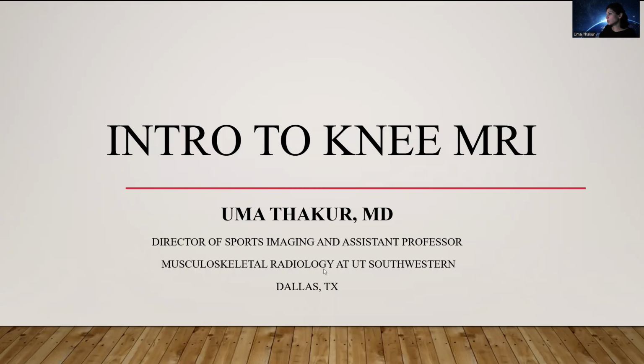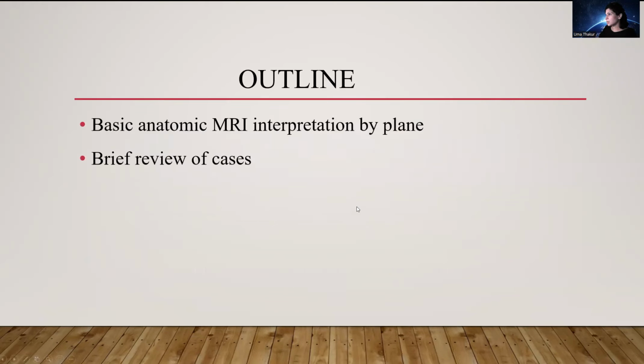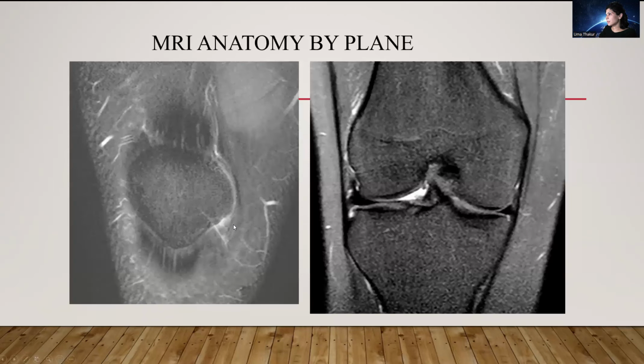Hi, my name is Thakur, and I am a musculoskeletal radiologist and director of sports imaging at UT Southwestern in Dallas, Texas. I will be giving you a brief introduction to interpretation of knee MRI. We will go over basic anatomic MRI interpretation by plane and a brief review of cases.